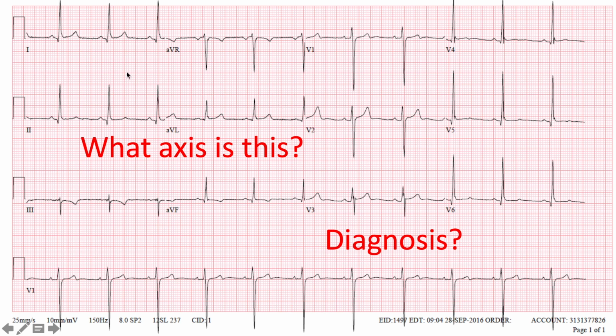Okay, so lead 1 is positive, lead 2 is positive. We know this is normal. That was less than 5 seconds, easy enough. Diagnosis, this is going to be left ventricular hypertrophy. You can tell this by the deep S patterns on V1 here. See how they're going off the page? And then also here. Now there is criteria for actually counting these, but it's not vital for this lecture, so I'm not going to get into it.